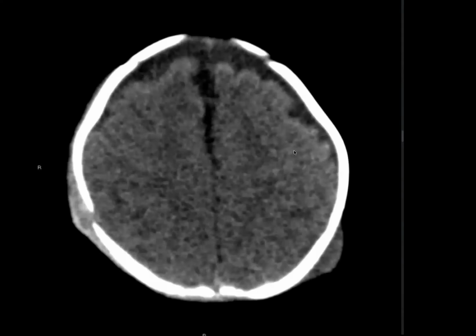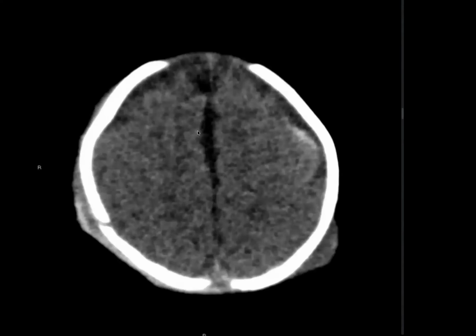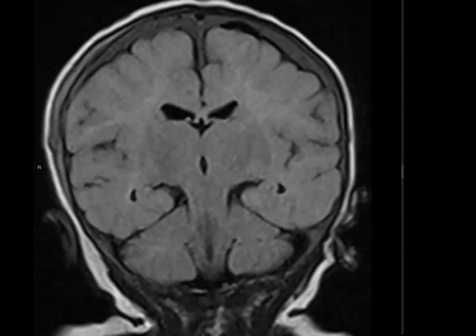But you should be a bit more definitive in calling the sulcal densities subarachnoid. Don't use SAH, they don't often know, they don't use these acronyms here. So call it subarachnoid hemorrhage. Okay, and the question: you always remember you have to earn the next sequence or the next modality or the next step. So when you say MRI brain, make sure that you have a list of things needed. So you can say I want it for better characterization of the subdural hematomas, which you did.